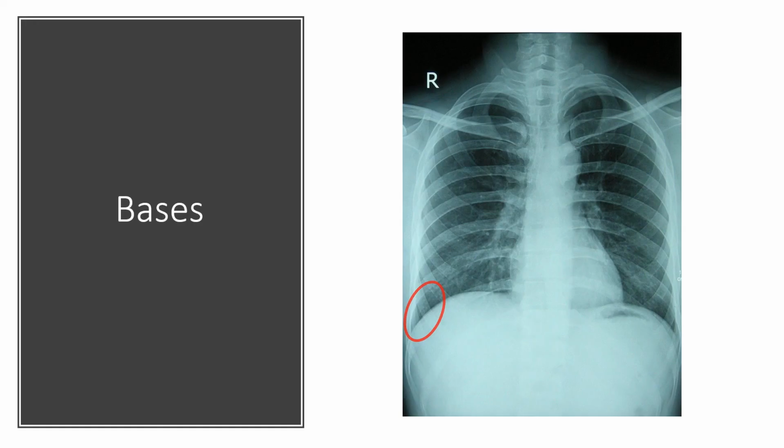Right, and so here I know this is starting the bases, but when we're looking at this, do you see how the clavicles are in their normal position? This is not an apical lordotic, right? The clavicles are in that normal position, so the lungs actually do curve up and start above. So you have 1, 2 ribs above the clavicles, and then 3, 4, 5, 6, 7, and 8 ribs going on here. So just letting you see the different things.